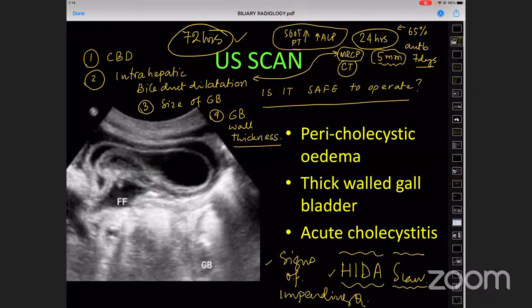And if we're not sure whether this pain in the right upper quadrant is due to acute cholecystitis or something else, could it be some other funny thing? Okay, just on this point, a bad thought: can it be an acute pancreatitis, detected quickly on this imaging, MRI or MRCP?